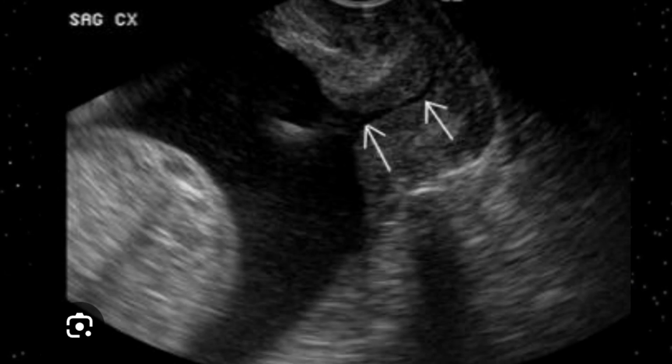This is another important slide, and if I were an examiner, I would definitely put this slide in front of my students and tell them, please explain that. But anyhow, today I'm the student here for you, so I'm going to explain it. Look, the fetal parts are visible on the left side. Amniotic fluid is clearly visible. The first arrow is indicating the internal os.